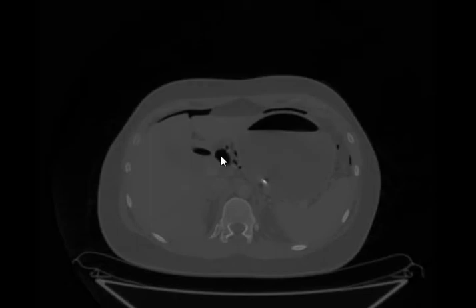You don't know where it is exactly. You might try to give some oral contrast to see where it's leaking from. At least you see if it's collected anteriorly or posteriorly. It gives us a clue. But to have extraluminal air in a patient with no surgery, definitely there is some kind of perforation.